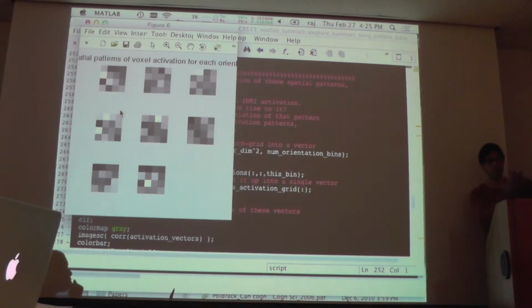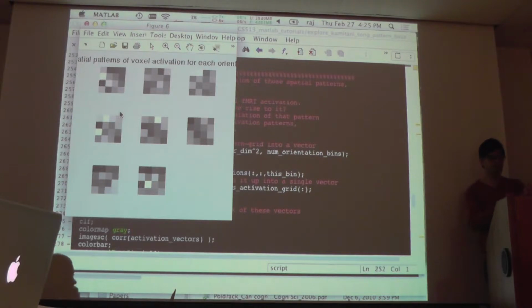So that's one of the reasons why correlation is helpful. I'm just recapping what we already discussed. The first thing correlation does is it gets rid of the mean of each image and just looks at the pattern between them.